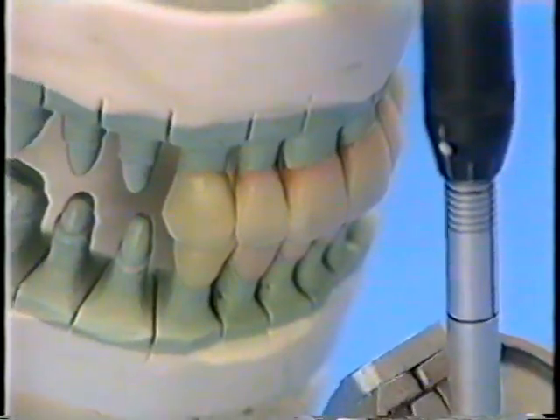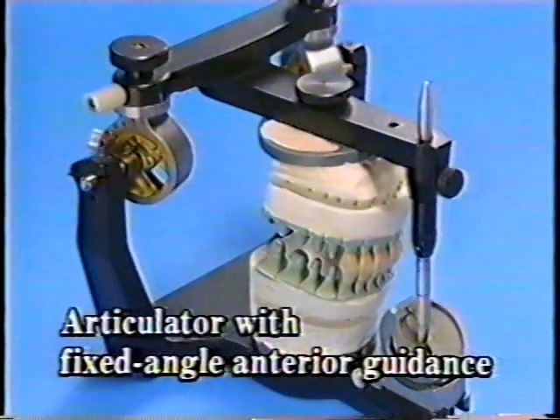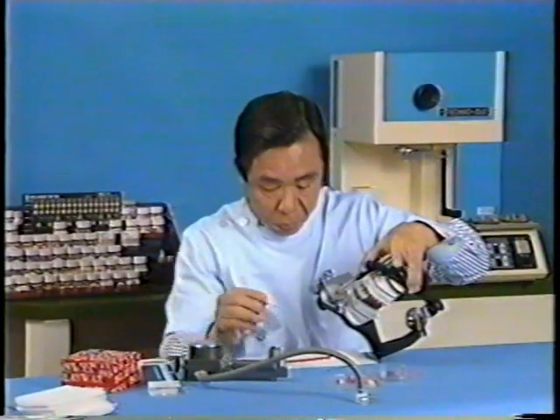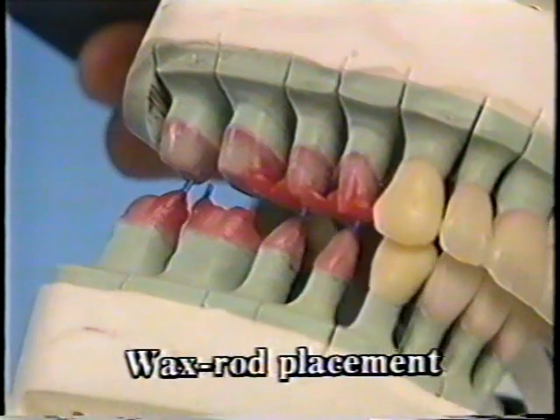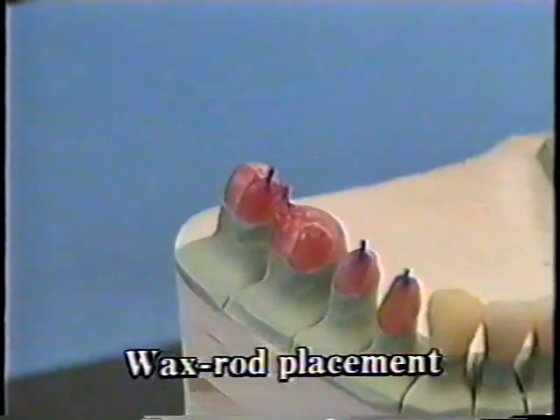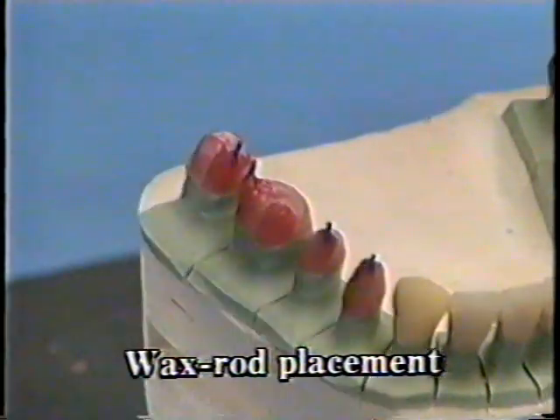For instance, in the case of a patient requiring full mouth reconstruction, we can use this technique to produce a crown out of wax, which would then serve as a three-dimensional blueprint. We'll begin by outlining the position of every cusp and marking the occlusal reference points with wax rods.